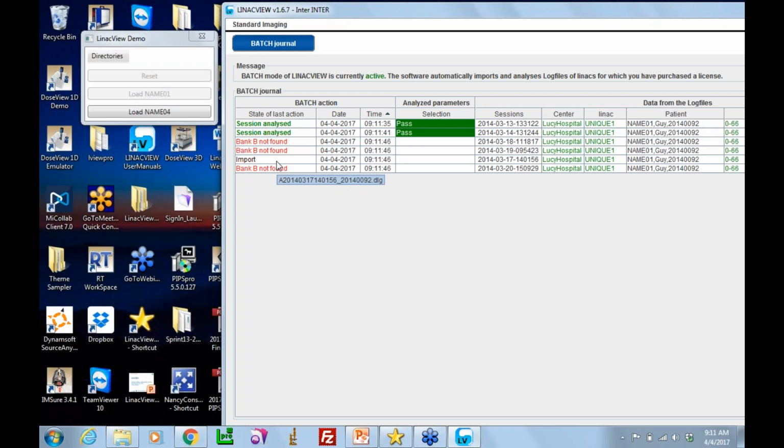You can see it. And what it's saying is that it's calculating a bunch of things. It's comparing RT plan control points against log file records. So if you have 180 control points and 3,000 records, which is not a strange number, you're doing all those checks in that short amount of time.